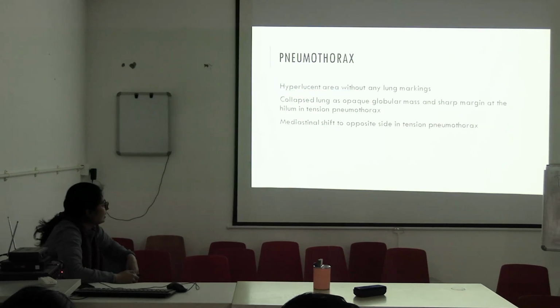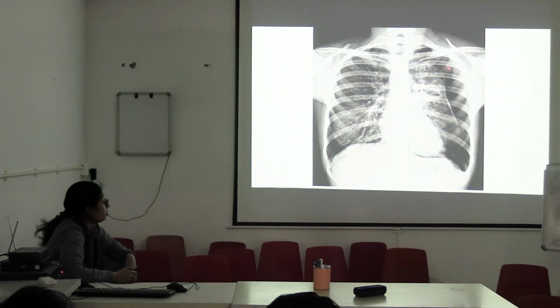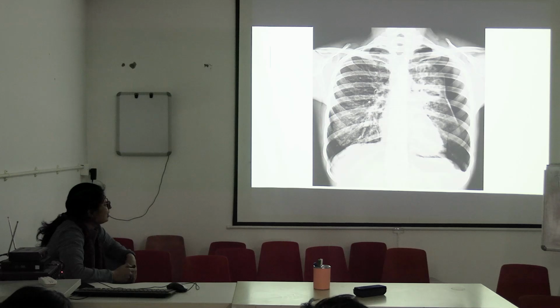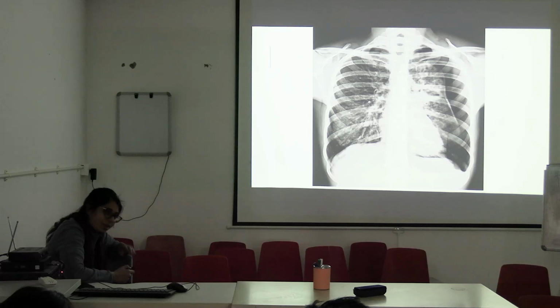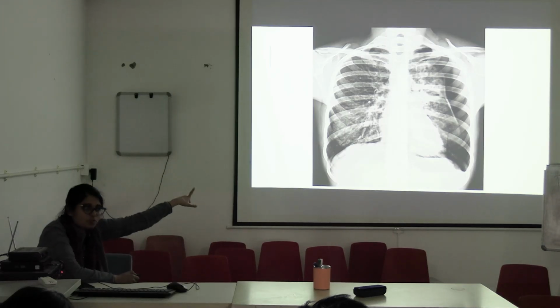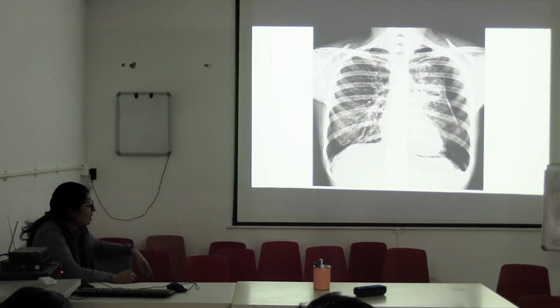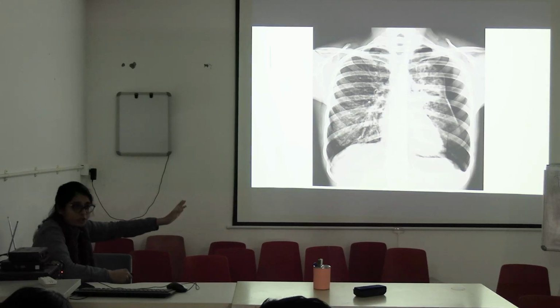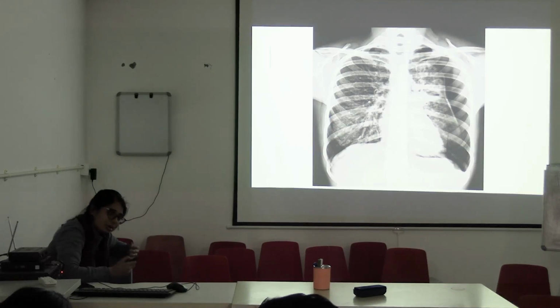তাহলে এইখানে এই এক্সরেতে তুমি position of mediastinum কি করে দেখছো? Number 1 is the tracheal air shadow. Whether it is central, equidistant from the medial end of the clavicle, right এর দিকে একটু বেশি গেছে বলে নরমালিও রাইট এর দিকে একটু বেশি থাকে, বাট জাস্ট লুক এট দ্য এক্সরে, দেয়ার ইজ নিউমোথোরাক্স, সো লেফটে একটু বেশি পুশ করছে একটু. And also if you see that the heart is shifted to the right or to the left, you will comment on the mediastinal shift.